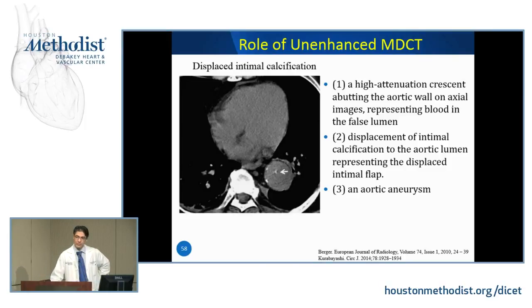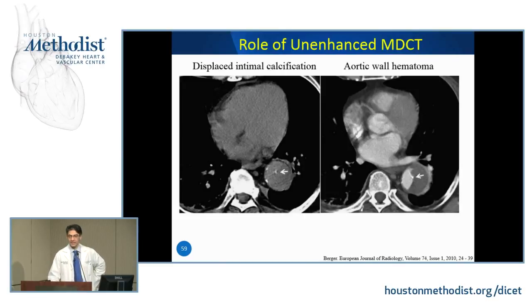Non-contrast CT can help you with dissections. Believe it or not, the intimal calcium gets displaced into the middle of the artery, and we can see that very nicely with a non-contrast scan. And here's the corresponding CT scan showing you that image, showing you the pathology.